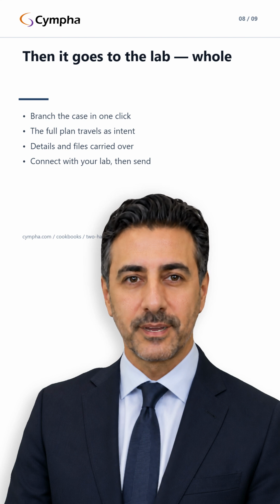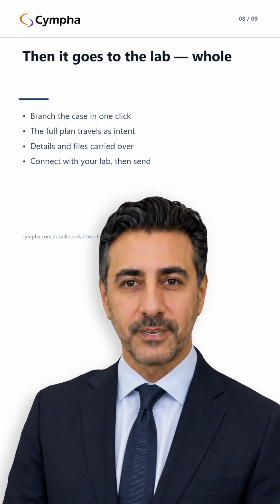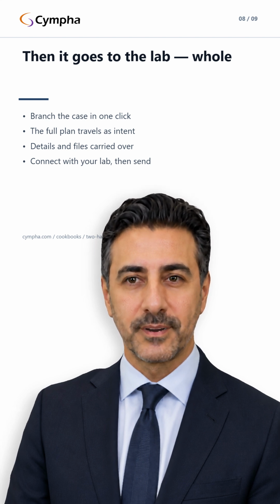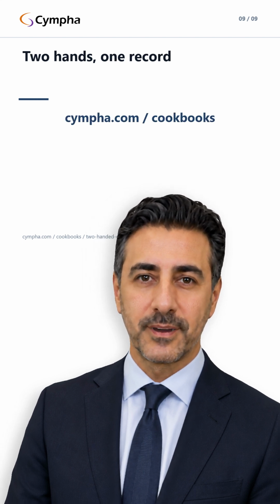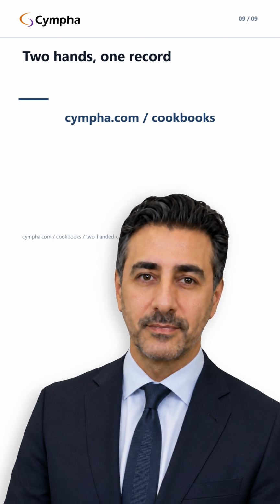If the treatment needs a lab, one click branches the case. The patient details, the files, and the doctor's full reasoning all travel with it. The lab starts for what you decided, not a one-line brief. You connect with your own lab first, then send the case their way. Fewer questions coming back. Less rework. A case that arrives already understood.